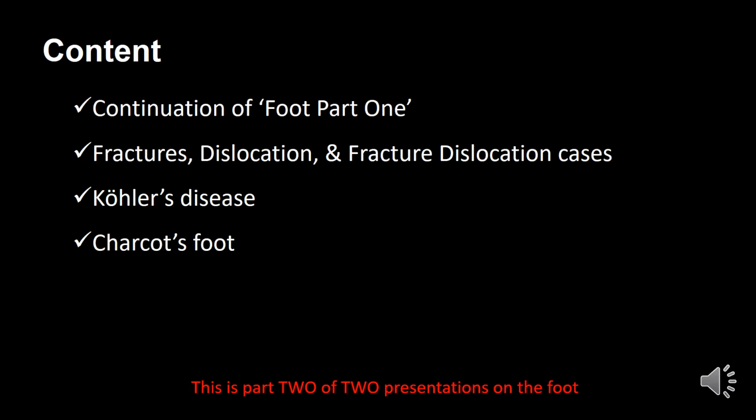So we'll continue to present you with a series of cases, fractures, dislocations, fracture dislocations, and then we'll go on and look at Kohler's disease and Charcot's foot.